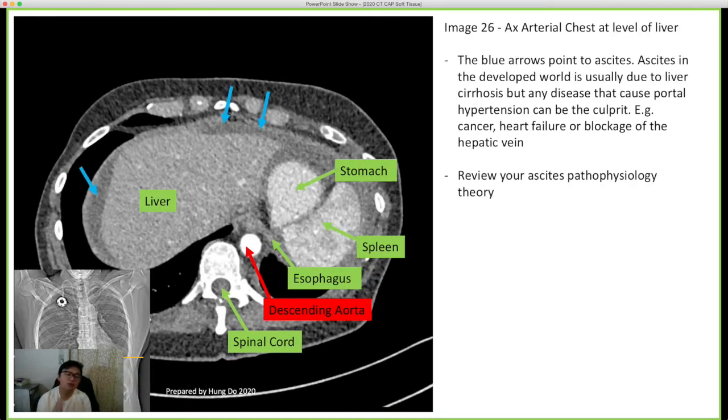Alright, so just before we move on to the next slice, I wanted to indicate something very unique about the spleen. The spleen is a very arterial heavy organ, and so it receives a lot of contrast in the early phases of your scan. The spleen is also a very unique structure in that it has a very unique internal structure. So it's very common to see a wave-like appearance, a mottled appearance. It's also very common to see this inhomogeneity of the actual spleen itself.